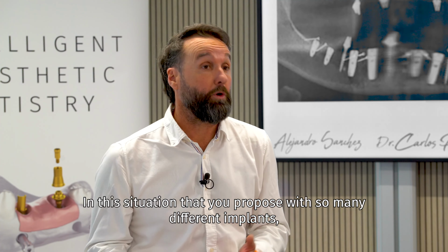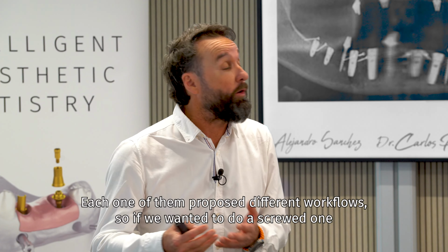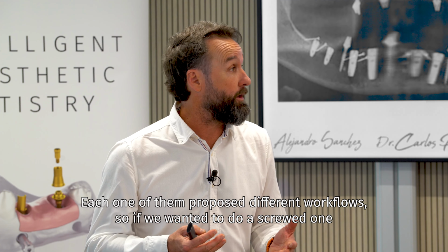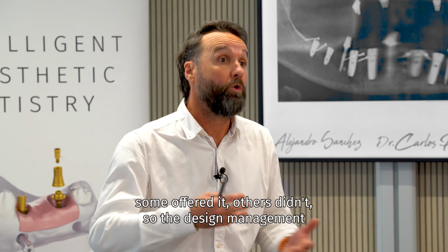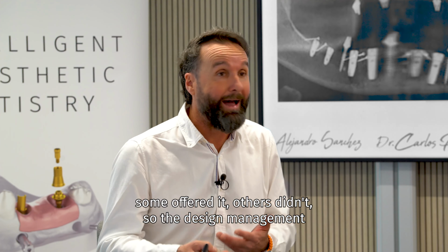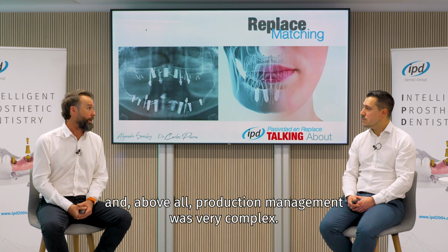In this situation that you propose with so many different implants, each one of them proposed different workflows. So if we wanted to do a screwed one, or if we wanted to do a direct implant one, some offered it, others didn't, so the design management and above all, production management was very complex.